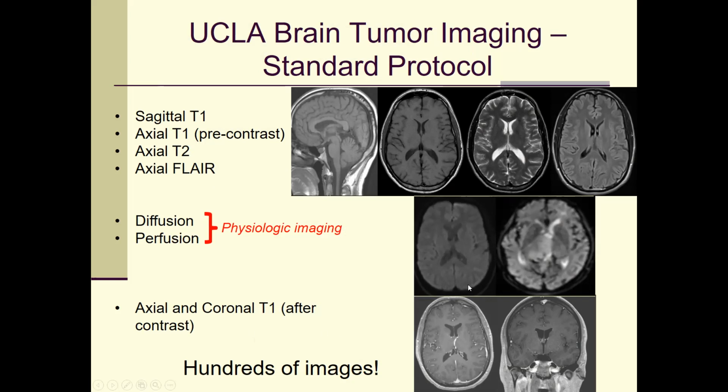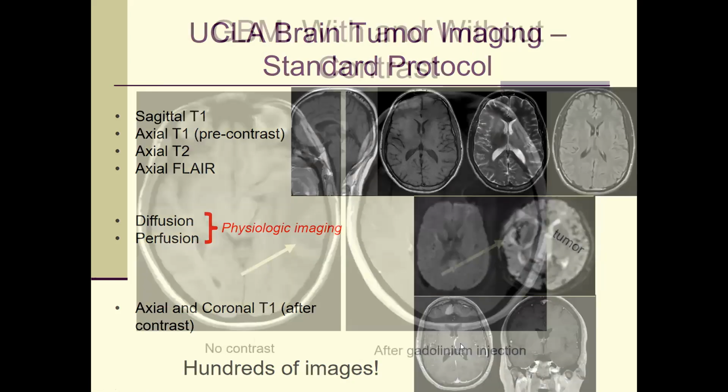And then these are pre-contrast imaging and post-contrast imaging. You can see the vessels are enhanced. So this contrast technique can help you to detect more tumor.